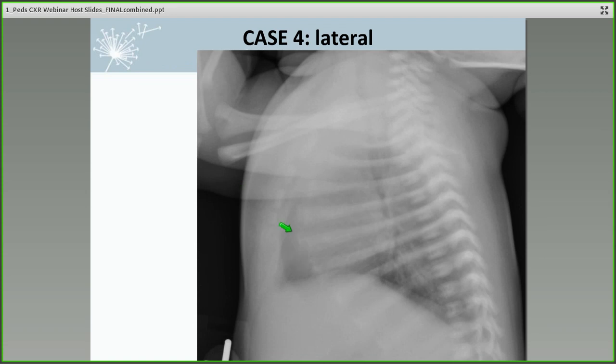image. So again, this is not a great quality image, but again, you see hyperinflated lung. Look how deep the posterior costophrenic angles are. In addition, if you evaluate the hilar region, it looks fairly normal. The right PA looks pretty good. The left PA looks great. There's no increased density. There's no suggestion of adenopathy here.